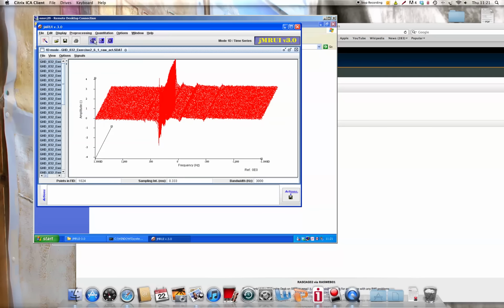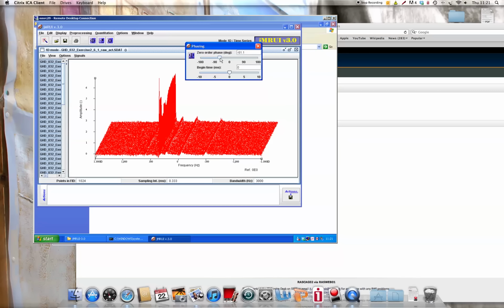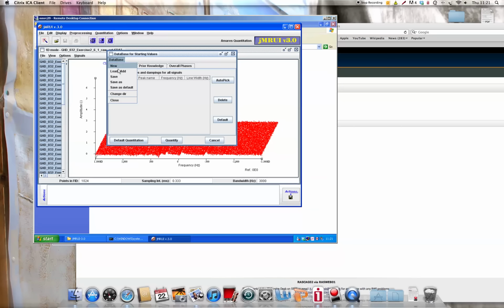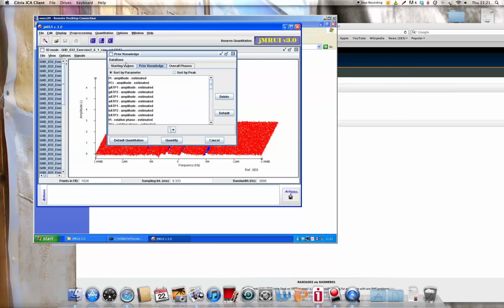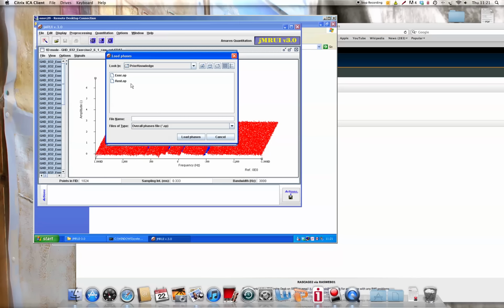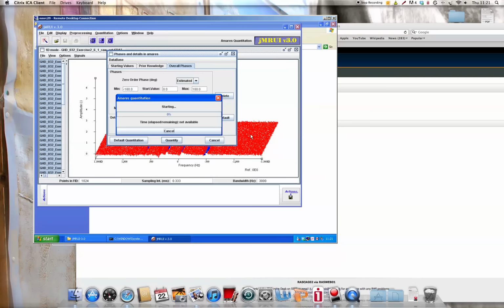Okay, you can have a look again at the phasing of it. There you see the drop in PCR and then recovery. You want to go to quantitation, MRS, database, and load with exercise again. So there you go. Okay, so you then want to quantify it again. Again, it'll take a minute to do that.